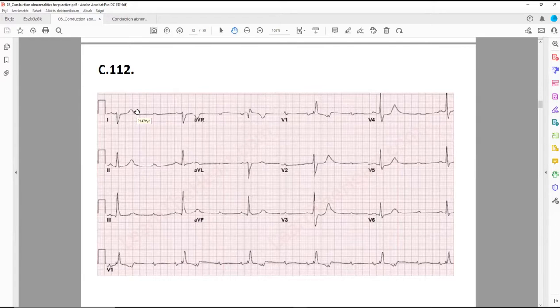So there is not anterior hemiblock. That's a posterior, not an anterior. Because if you had an anterior, you should have an extreme left deviation, not right deviation. Okay. So it is only bifascicular, not trifascicular? No, because trifascicular includes the first degree AV block, and that's a high degree AV block. Okay, so by definition, it doesn't include the trifascicular. All right.